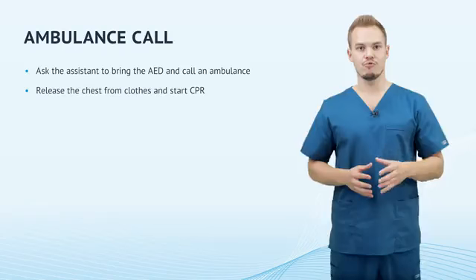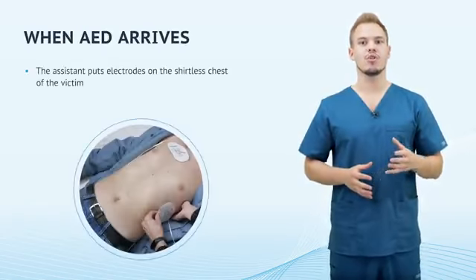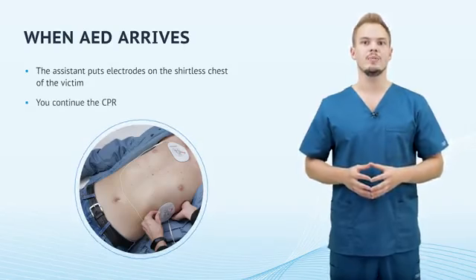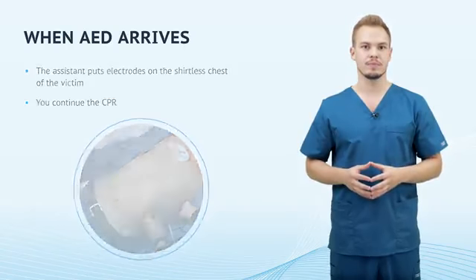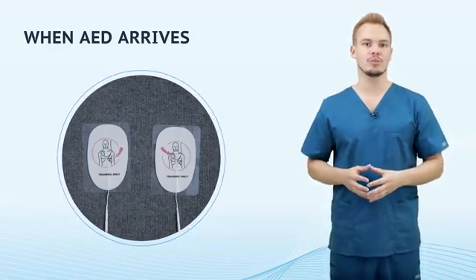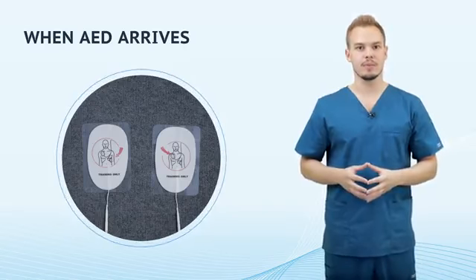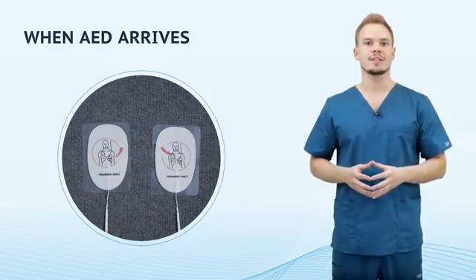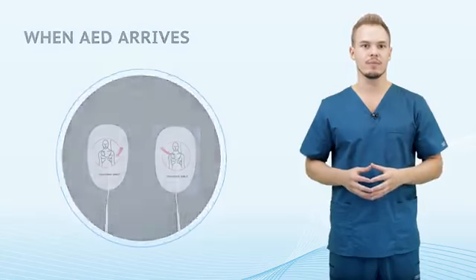As soon as the assistant brings the AED, turn it on. The assistant puts electrodes on the shirtless chest of the victim while you are continuing the CPR. Teamwork is essential here so as not to interfere with each other. It is often indicated how to place the electrodes on the victim's chest properly, right on the packaging or on the electrodes themselves. The correct location of the electrodes on the chest is crucial and associated with the anatomical and physiological characteristics of the heart.